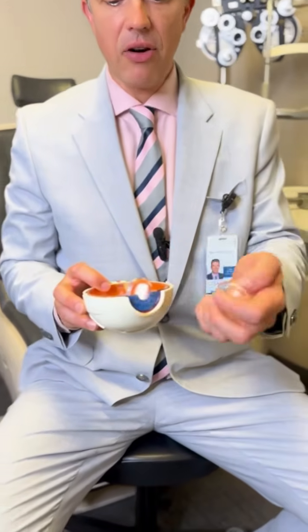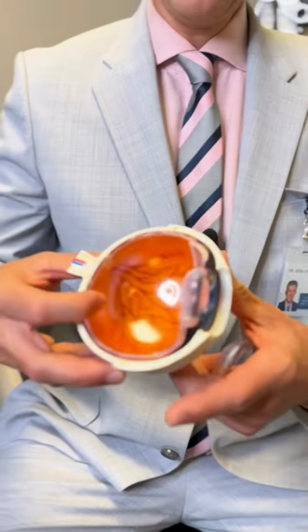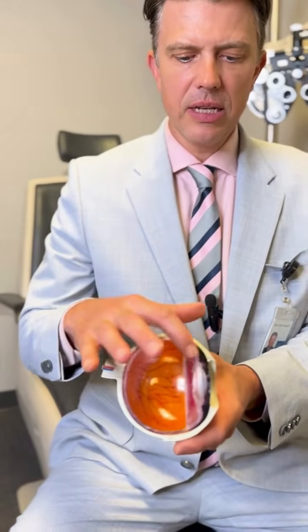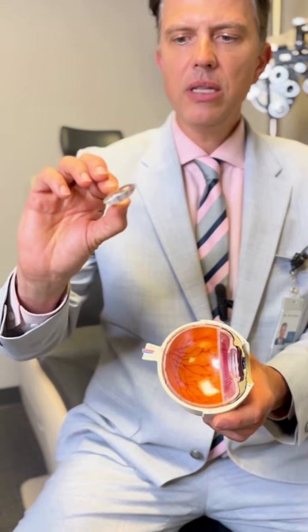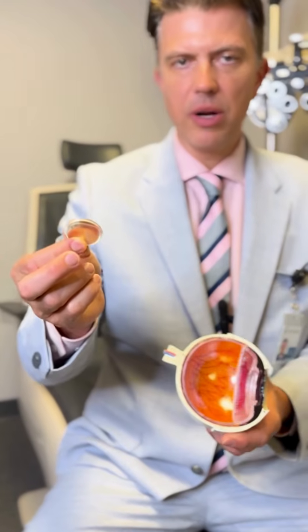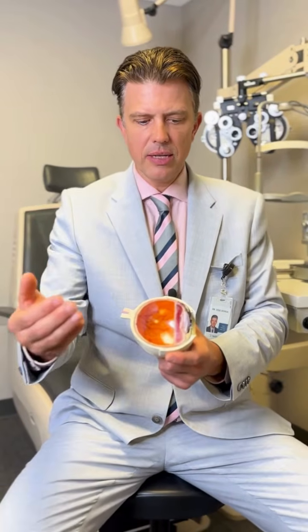Behind the cornea, we have our iris, and the iris is where your pupil is located. And then right behind that, you're going to see on cross section here is this lens. This is a sac of protein. The proteins are, at first, when we're younger, very flexible and they bend quite a bit, and it allows for dynamic vision to occur as the lens of the eye flexes. The ability for us to see distance versus near is shifting.